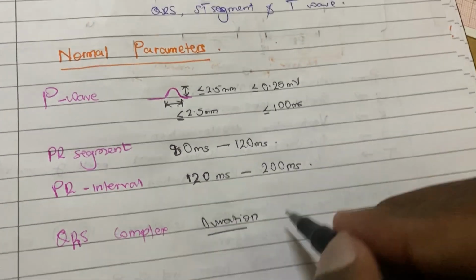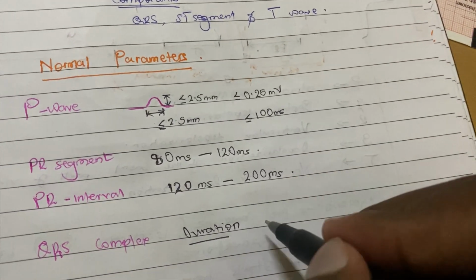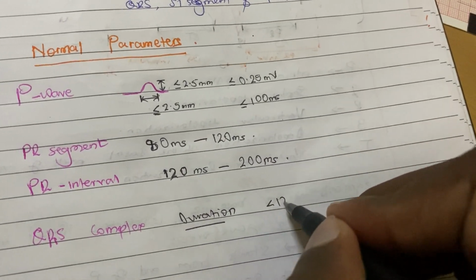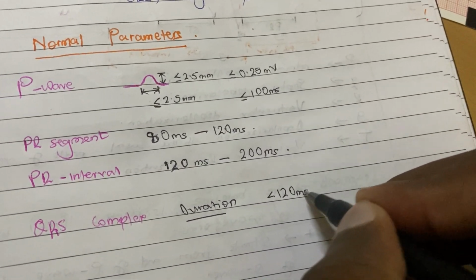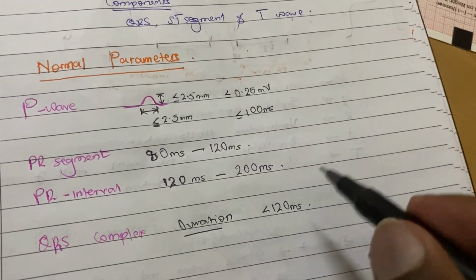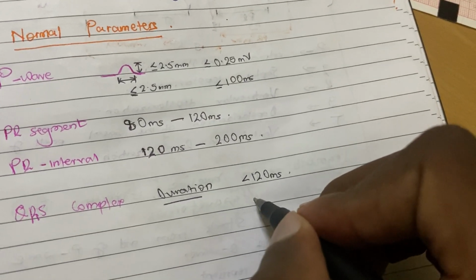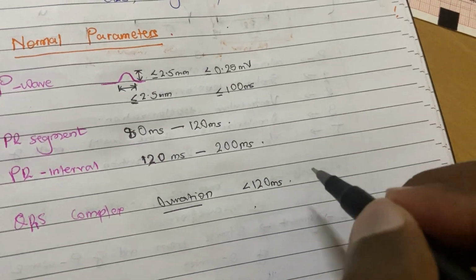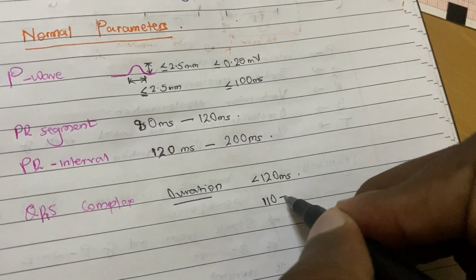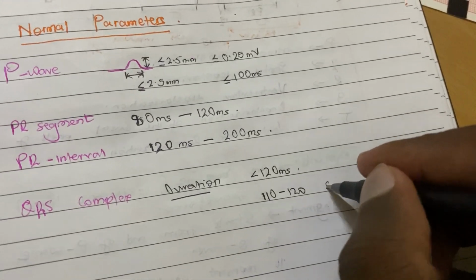Duration, the normal one is less than 120 milliseconds, but above 120 it is wide, and 110 to 120 it is slightly wide.